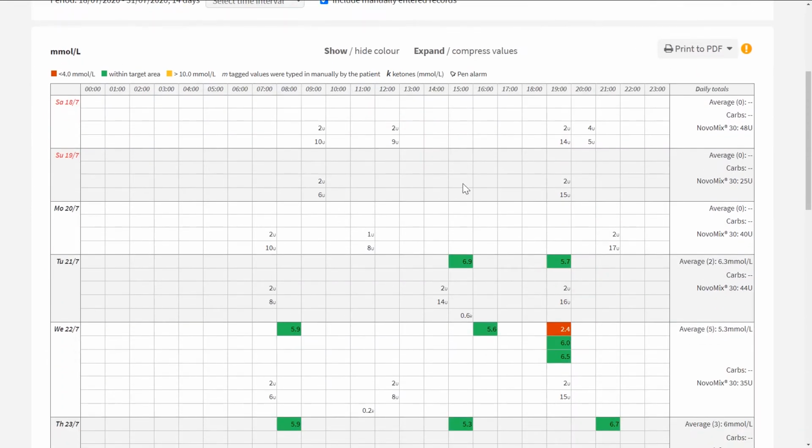see here in the graph below that we have injection information presented alongside other useful data. You'll see that in the insulin data here, we have therapy doses such as this one, 9 units of insulin, that are preceded by much smaller doses, here 2 units of insulin. In this case, it's possible that the 2-unit dose is a priming dose, again also known as an air shot.